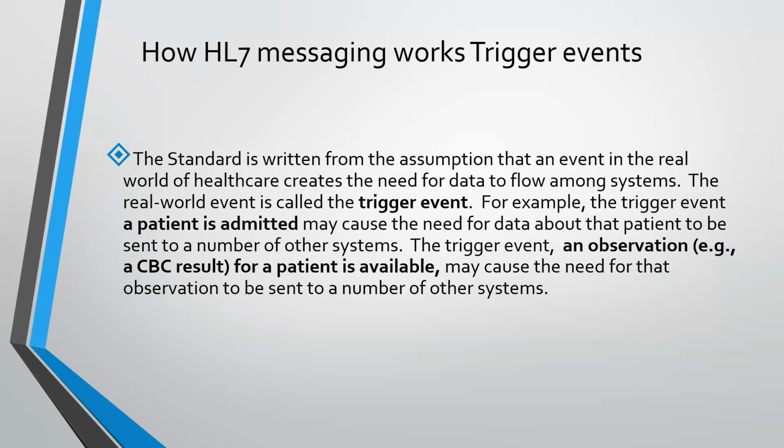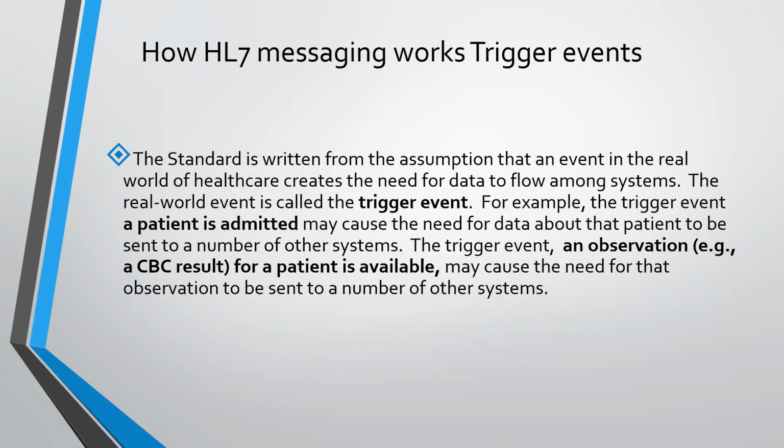Once the patient provides all of their information, the receptionist would go ahead and create the patient record in their application, right? Once they create the patient within the application, this patient information should flow from the PM system to the EHR system, because the doctor should also know the demographic details, the patient name, his age and all. How will he get to know if he does not receive the data? So eventually it is needed. It is an inevitable aspect that has to happen. Data should be sent from the PM system, which is the receptionist application, to the EHR system, which is the doctor's application.